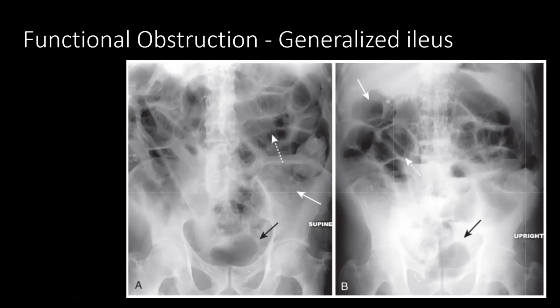So the small bowel will not be dilated if the large bowel is dilated in a mechanical obstruction of the colon. But if I had an incompetent ileocecal valve that allows the retrograde passage, I will have something that might look like this.